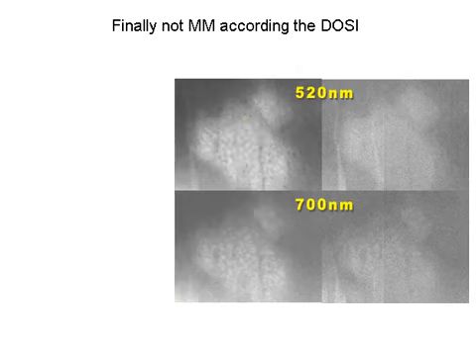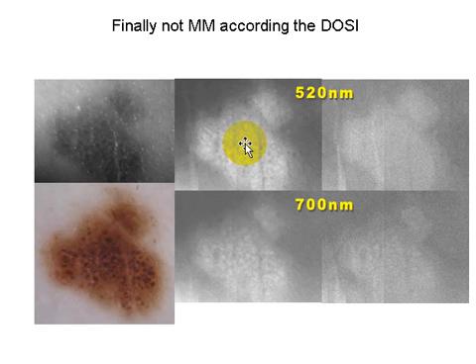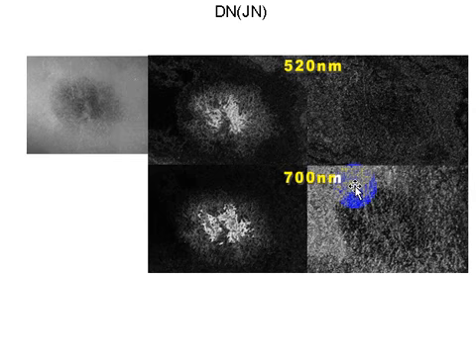The last example is about a lesion which 3 dermatologists say they suspect to be a malignant melanoma, or at least melanoma. And my algorithm shows that there are some boundaries indeed, but the second algorithm shows that the lesion looks hazy here, very similar to other non-dangerous lesions, where there is no correlation between the algorithms.